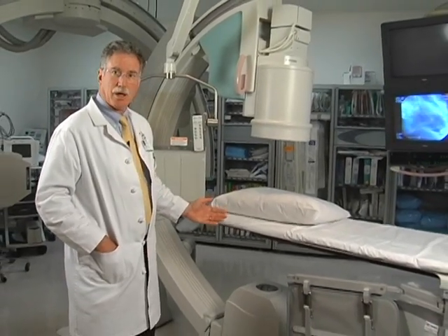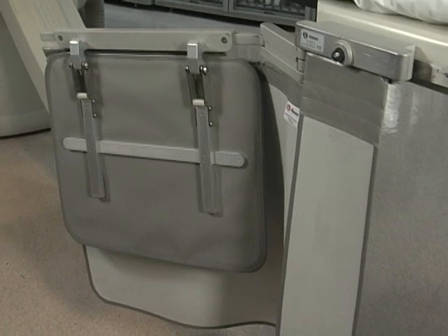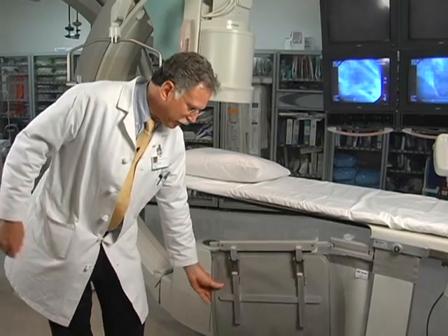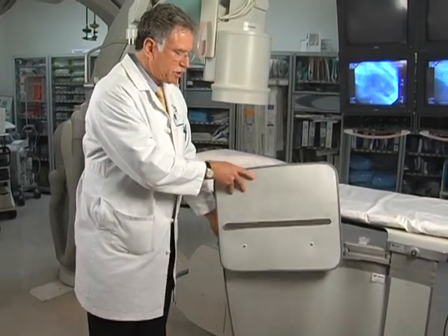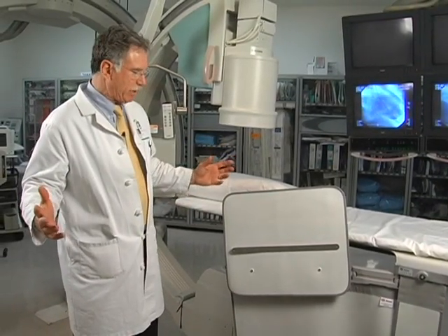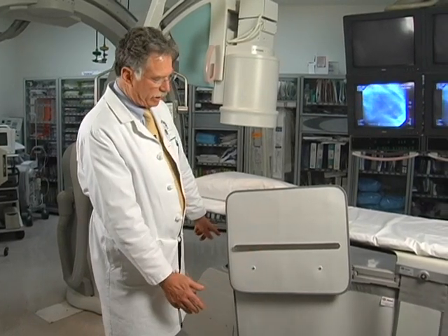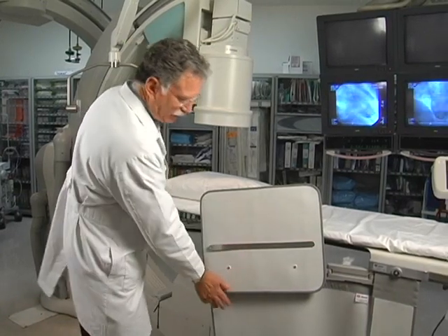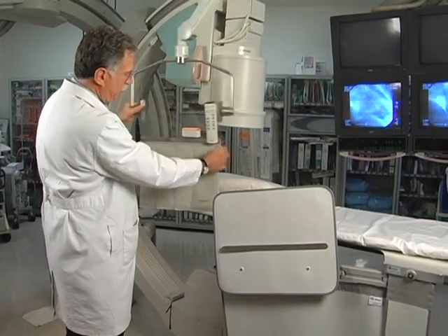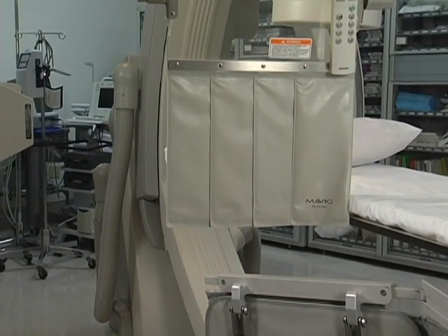X-ray rooms are lead lined, as this one is, and there is lead shielding available to protect the operators, because they're in the cath lab every day. These lead shields protect the operators from excess radiation scatter. So X-rays come up through the patient. When they hit the bony structures, they're scattered, and the highest areas of X-ray exposure are those closest to the X-ray generator, and they are blocked with lead shielding above and at the waist level and below, and also a movable shield here, which has lead, and a lead shield to protect the operator's upper body, face, and arms.